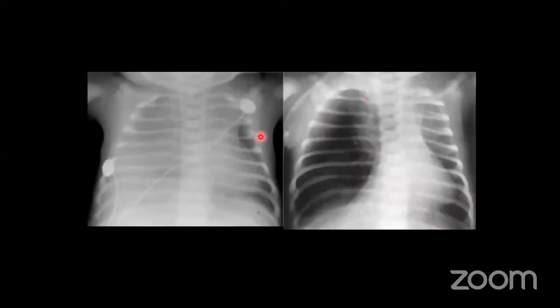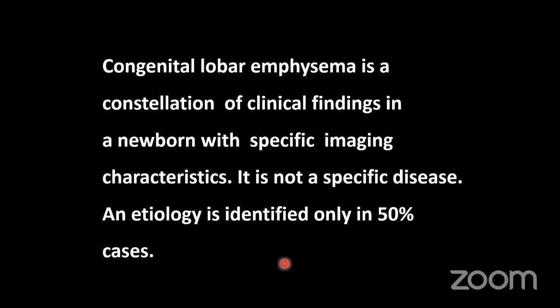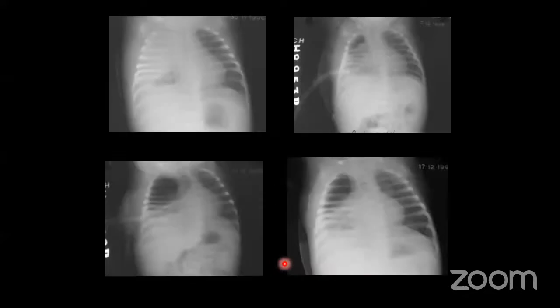This is another thing. So we thought in the first day when the baby was born with grunting and respiratory distress, there's opacification. So naturally we thought the child must be suffering from pneumonia or aspiration or something like that. So we waited till the next day. After 24 hours, it is being replaced by air. So initially, it was not air-filled, and on the next day it becomes air-filled. So it is the congenital lung cyst. So congenital lobar overinflation we sometimes see.